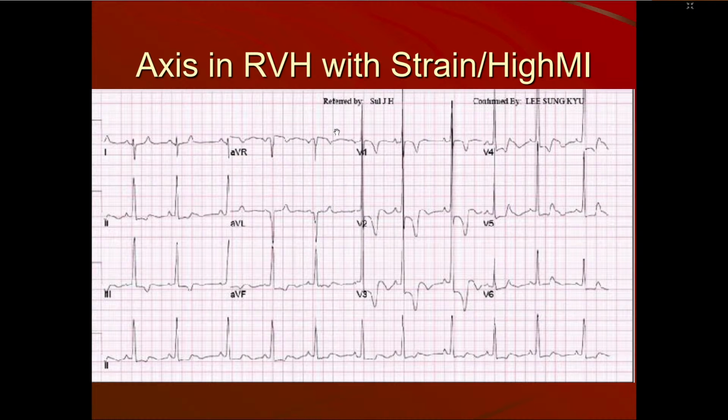Now this is a very good ECG. You see in this ECG, lead 1 is negative, R is small, S is deep. We plotted that circle at 180 degrees. The negative component of lead 1 is at minus 180 degrees. AVF has a very positive, good R wave, so positive AVF is at plus 90 degrees. It is a right axis deviation.